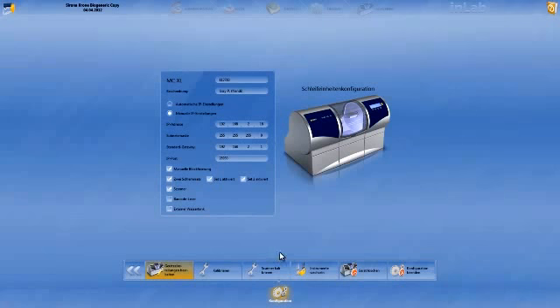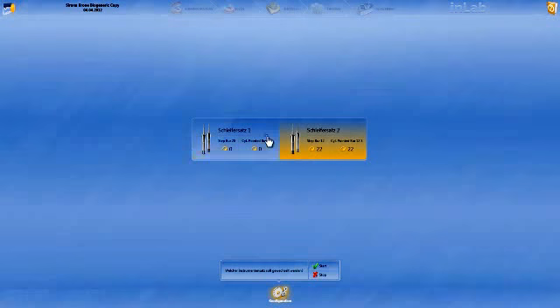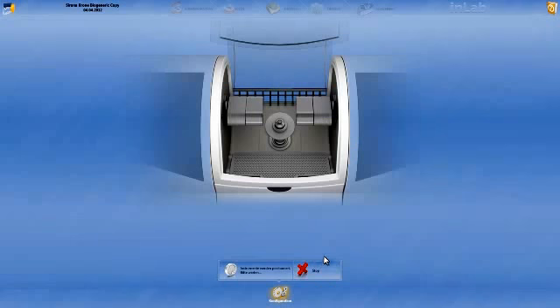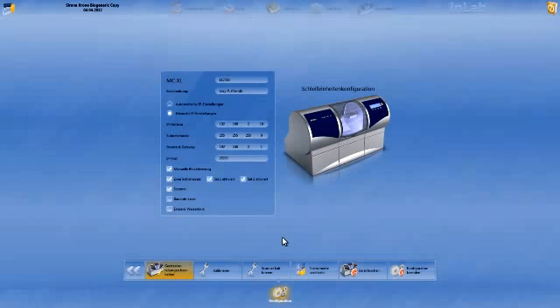To change the instruments, I click on Change Instruments, and can then change to either burr set 1 or 2. To this end, I have to click on Start again. The machine instruments are positioned. I state which instrument is to be changed and confirm again with Start. After configuration of the milling unit, I click on End Configuration.